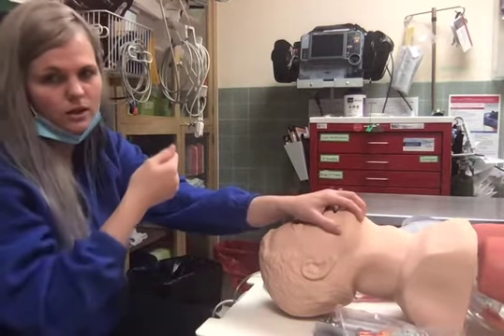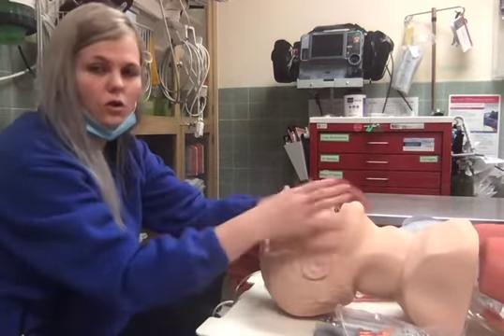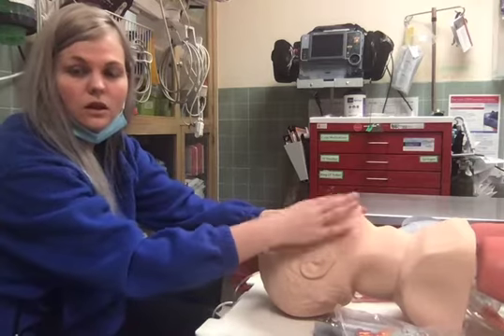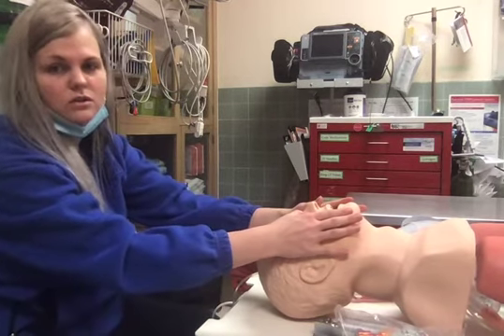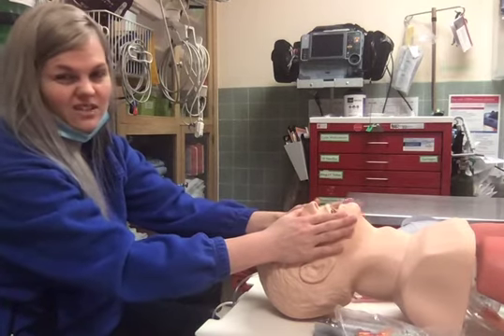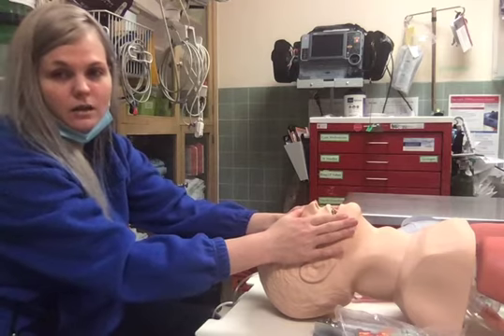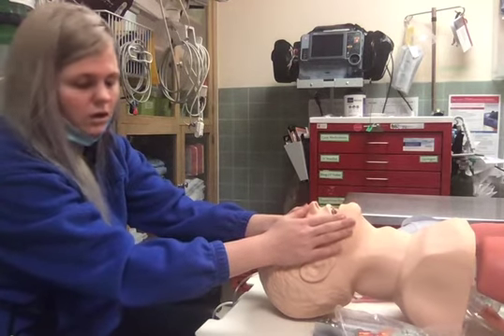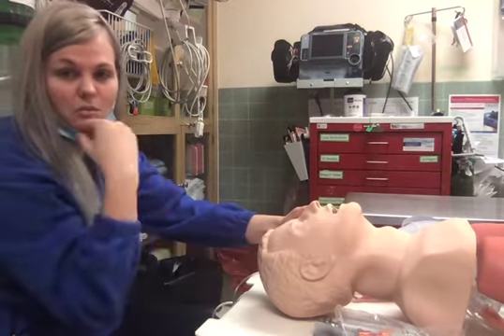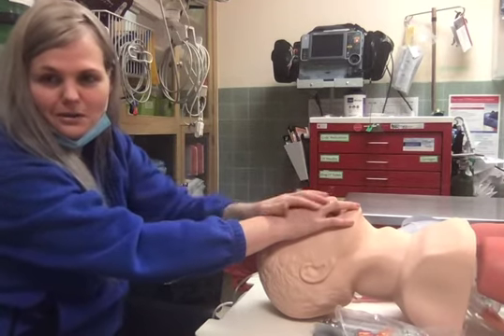It's not a quick release situation, and it goes around to hold that mask down and get a really good seal. So you're getting that pressure that you need, but you're also increasing your risk. If I put this on anybody, if they're sick enough that they need this in our ER, in our ambulance, or in our helicopter, I'm giving them some Zofran or something along those lines to help prevent them vomiting in that mask and creating an aspiration issue, and then now you're down a whole other track.